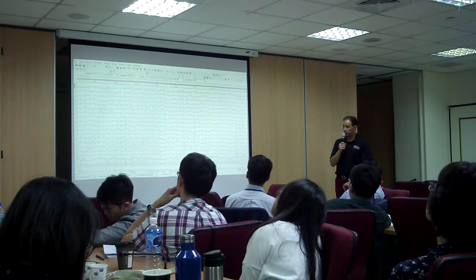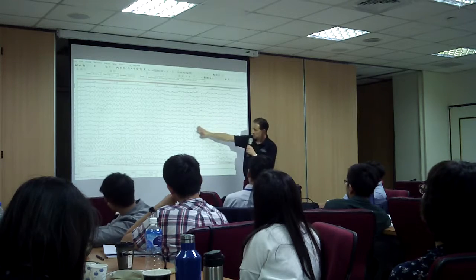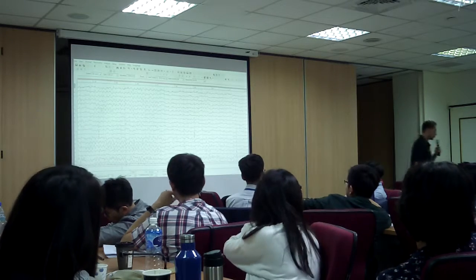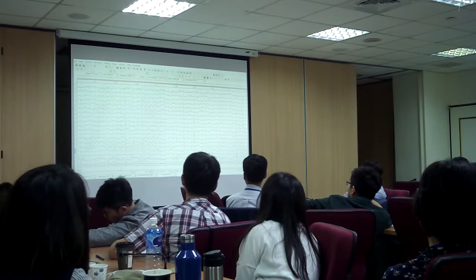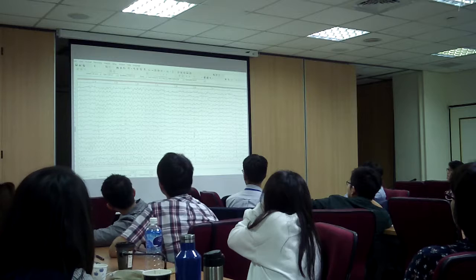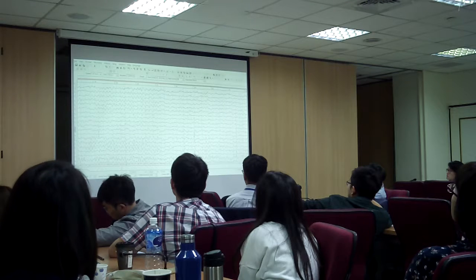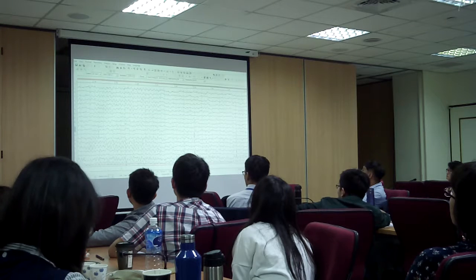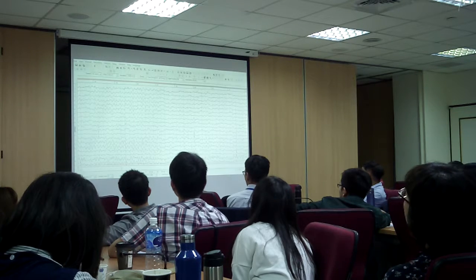We have the epileptic discharge, and we need to see where it is the highest. So if you look at this segment right here, where do you see the amplitude is the highest? Oh, wait, you can see the channels. I'll tell you what channels they are. This is P4, T5, C4. So which one is the highest? Is it P4? Is it T5? Is it C4? Which one is the highest?